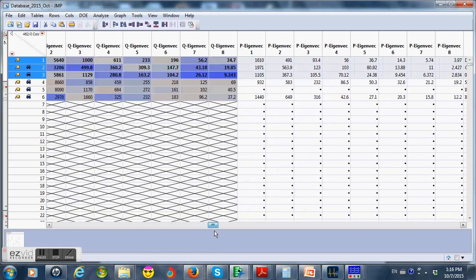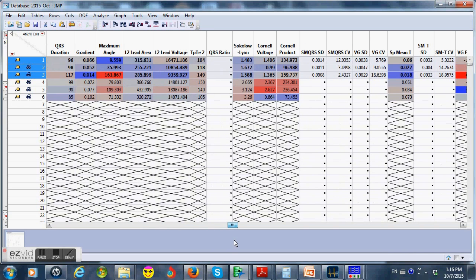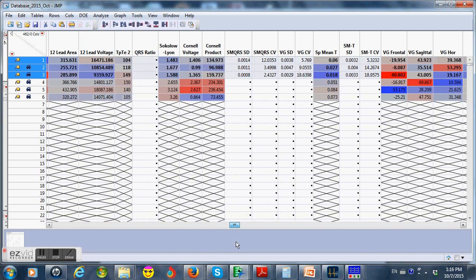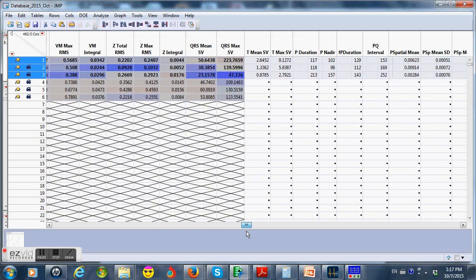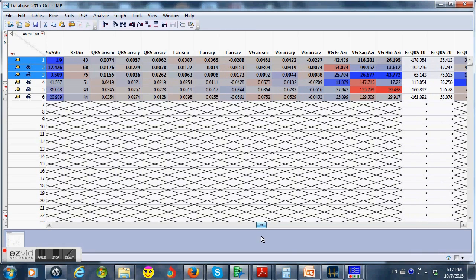Now here we get into some of the signal averaging and other 3D ECG, T-wave complexity parameters. So some 3D ECG parameters like this here that involves a coefficient of variation that combines a temporal aspect, you won't have those in the snapshot ECG either. But I just want to show you the wide, huge variety of parameters.